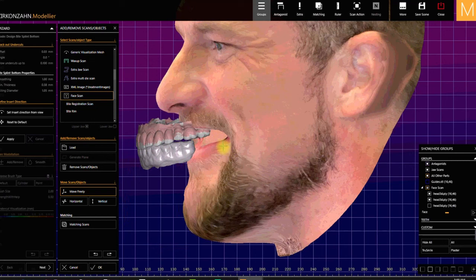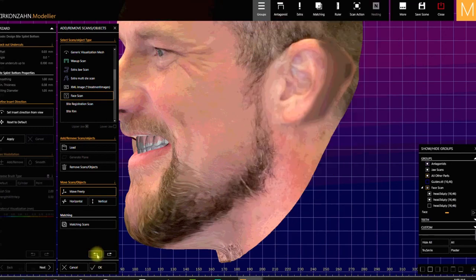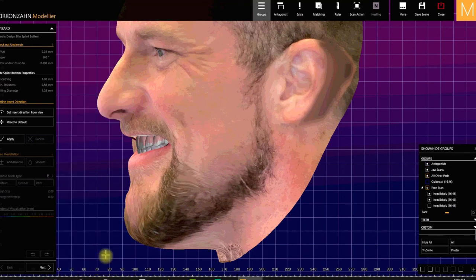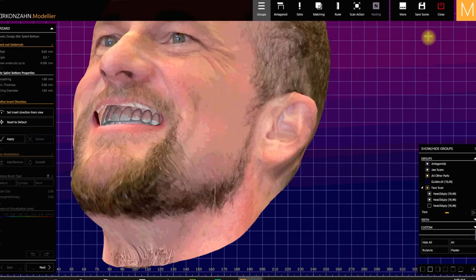You guys might do that too. Don't worry, you didn't actually save anything yet, so go back here and back up a step, and it'll bring it forward, and bring the other one too, and leave them there. Now I'm going to say OK and keep them. So now you can't accidentally move them. So I would say you want to save this now.